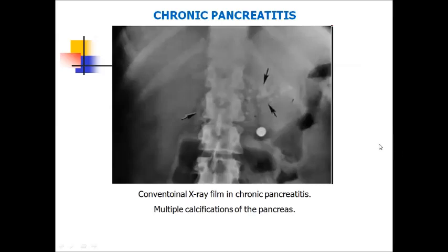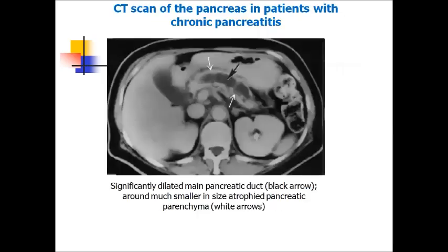Appearance of chronic pancreatitis on abdominal X-ray film: conventional X-ray film shows multiple calcifications of pancreas.